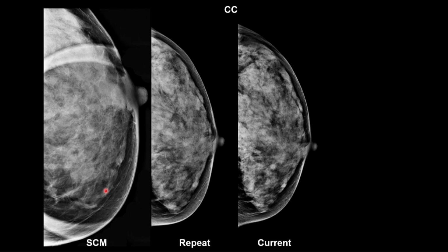Well, in this case, the workup should stop because there's nothing there. And since there are no findings on the current exam, the appropriate BI-RADS assessment for the diagnostic exam that you've just started is BI-RADS 1 negative, because there are no findings. You should add a sentence saying that the finding seen at screening was found at fine detail imaging to be superimposition of normal structures. And that's it for the case.